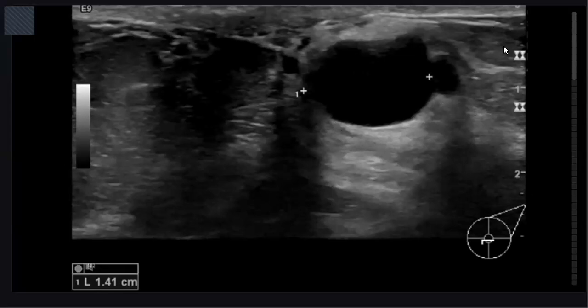Here is the ultrasound of the same patient. I can see this is likely the retroareolar large lesion, which is seen lobulated with well-defined outlines and cystic appearance in the ultrasound, which is of benign features, M and U 2, grade 2.